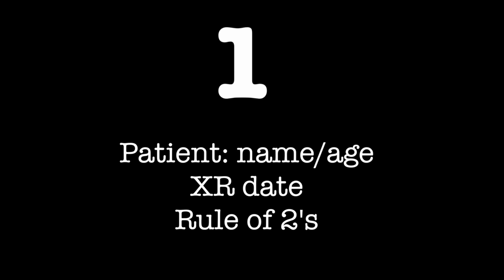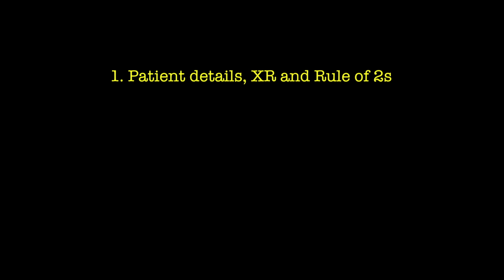So step 1. What is the patient's name, age, and date of the X-ray, and consider the rule of twos to make sure you have the right patient and the most recent X-ray. So now we can begin to look at the actual X-ray and describe it.